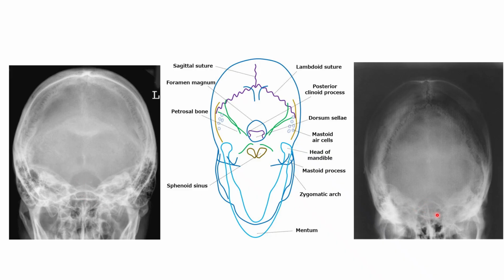Do they look exactly the same? No, they don't. They don't look exactly the same. Does that mean that this is not diagnostic? Absolutely not. They're both diagnostic images. Then we can look for the petrous ridges.